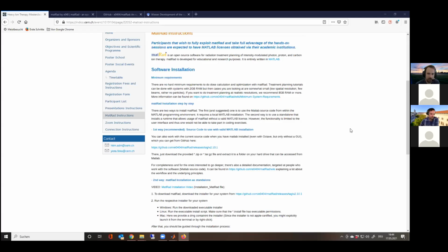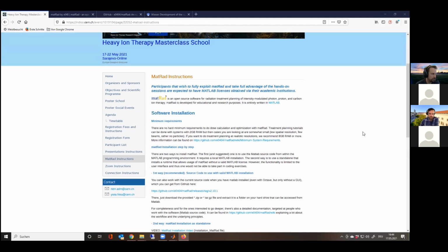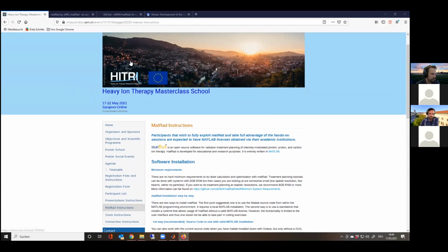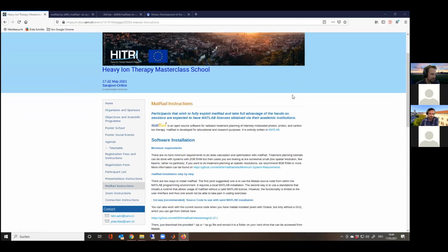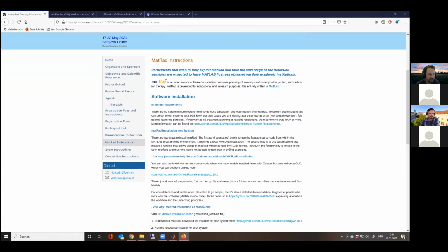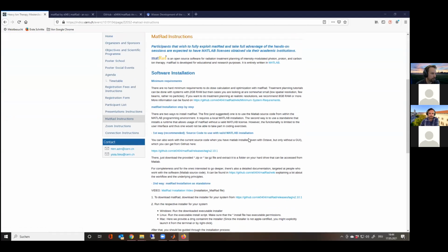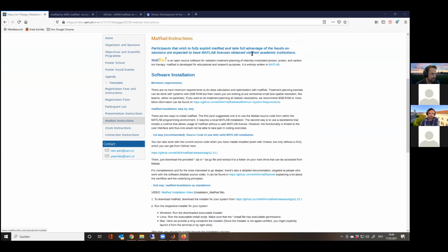Okay, so Damir just posted a link into the chat for all the people who are in here, and it should be accessible to everybody here who has access to this. I think everybody knows this page about the masterclass school, and there's a section called MatRad instructions. In principle, it explains everything, I hope, well enough to install it. And it has a few sections here.